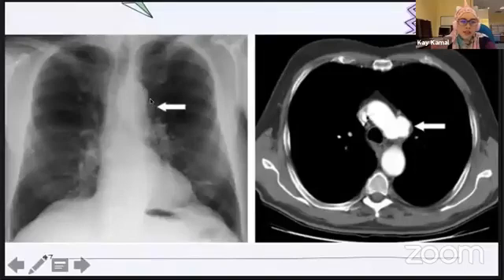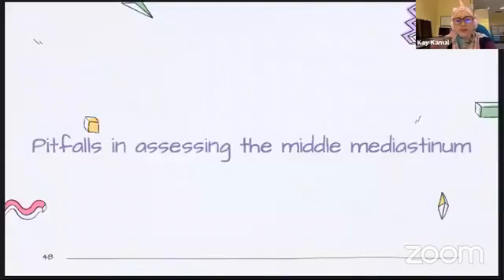And this one, we see another AP window obliteration, and this is caused by an aneurysm of the aortic arch. So the aortic arch is going up, and suddenly there's an aneurysm over here. So the usual interface with the lung is lost. So there's another density added to that, so we can see this kind of look. The thing is, in the middle mediastinum, there are a few varieties of normal vascular variants which we can think might be middle mediastinal disease, but it's okay.